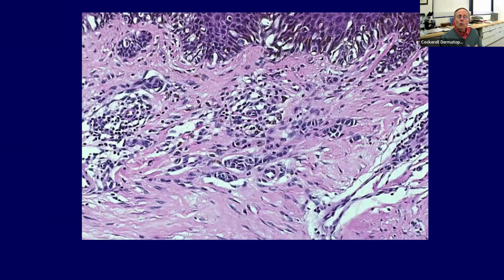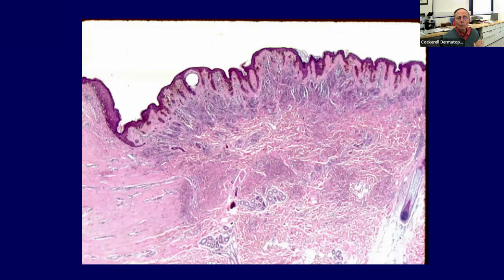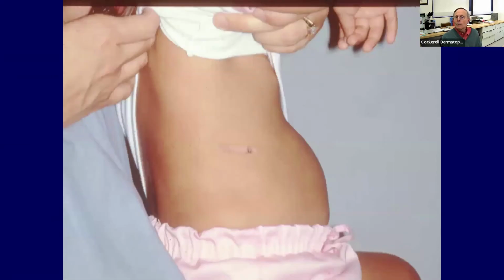And then we go to even lower magnification, we see some normal appearing nests of melanocytes here with a junctional component overlying it. And then at this lowest magnification, where we were looking before was over here to the left, which is an area of a recurrent or persistent nevus. This was a congenital nevus. It was undergoing staged excision, totally benign process.